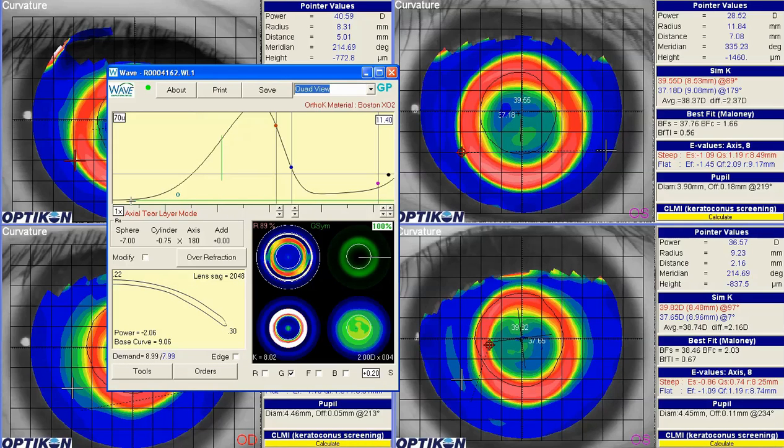So it looks like we've got quite a bit of bearing. What Wave is doing is really flattening the very center part of the OZ, and we don't want to get too much central bearing. So I think I am going to bring this down a little bit. And we're still at 0. So we still have a little bit of flare out at the edge. Maybe that'll get the lens to ride up a little bit higher. It's also flatter in the center.